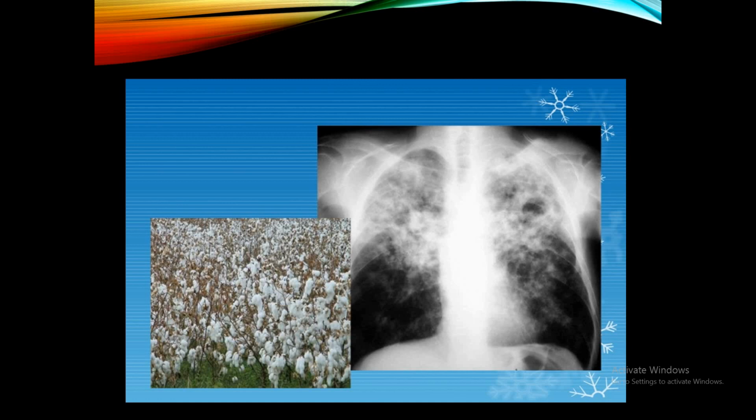Number 2, the distribution of this patchy opacification is in the upper zone. And number 3, the presence of cavitary lung lesions. If you look at the left upper lung zone, we have a rounded translucency which is caused by a cavity. So if we recap our thoughts: bronchopneumonia in the upper zones with cavitary lesions equals post-primary TB bronchopneumonia.